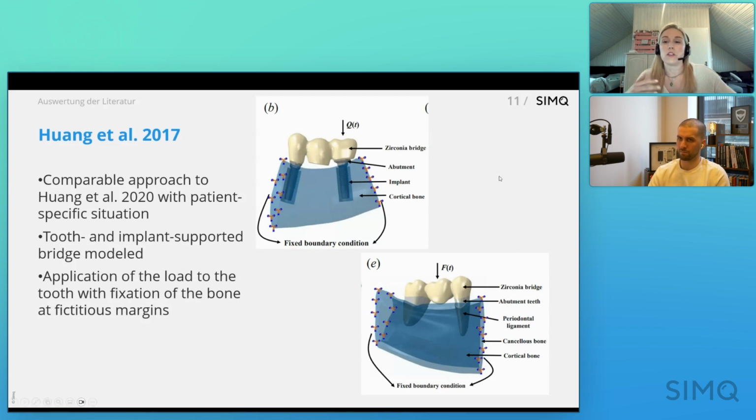And the difference is you can't just use the same calculation and say, okay, the bridge will behave this way as it would for metal, because the tooth has periodontal ligaments, and each tooth moves a little bit as natural bone does because it's a living organ. So then we know that the force is dispersed differently and deforms differently when the implant is metal.